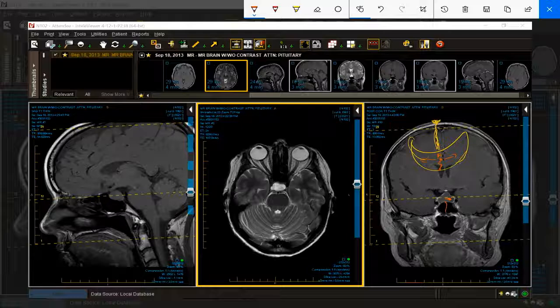And they do a nasal splitting procedure, transsphenoidal hypophysectomy, and they go up and they get into this sinus. Oh, now they're in trouble. They're on the wrong side of the pituitary lesion. Now they either have to break through here or start over, which is a big problem. So do pay attention to the sphenoid position, its septum, relative to the position of the pituitary microadenoma.